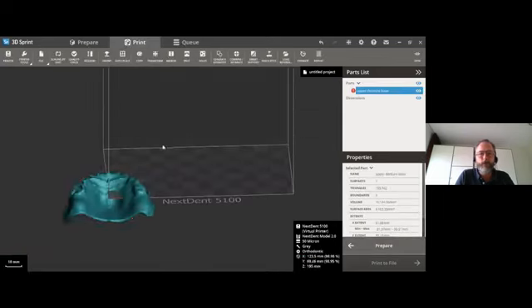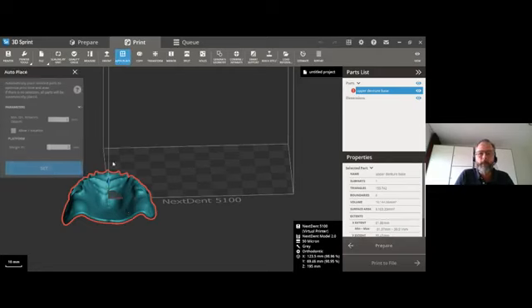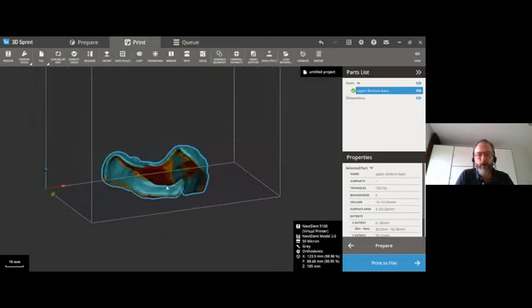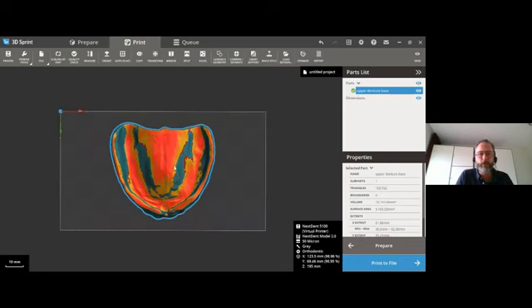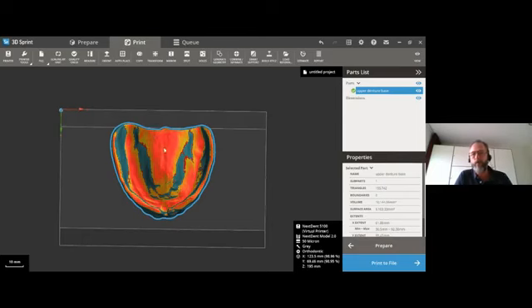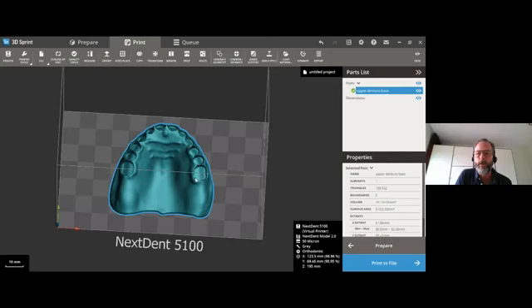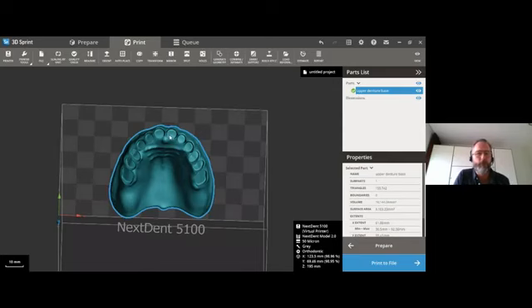And at this moment, we have found that the orientation that I just showed is, and we're talking about microns, no mistaking there. If you would print it like this, I'm sure that you will also have a fitting surface, but you can also see, because we all still have the down-facing surface on, that in this orientation, there will be a lot of supports inside of the denture. So this is, of course, not what we want. Although the support tips are very thin, you would affect the fit of the denture. Now, if you would flip it, then you will have the same issue with the teeth pockets. So the supports will be in here, and that will make fitting of the teeth kind of challenging.